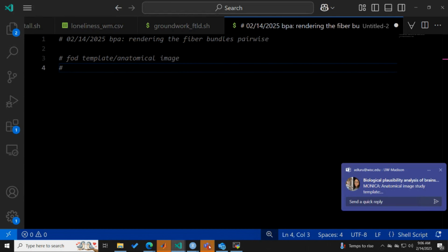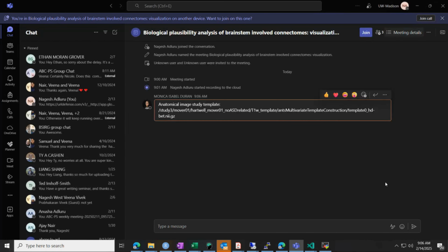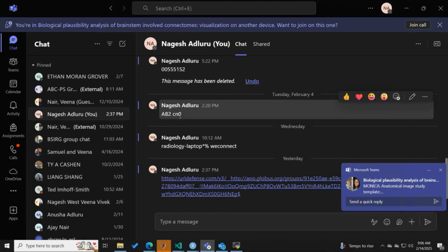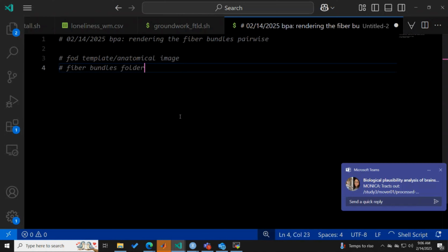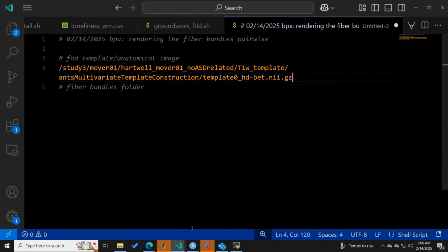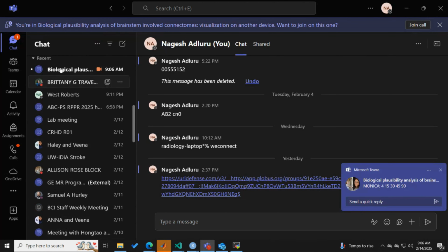And then the folder where the tracks are. I'm putting it in the chat too. And then you'll see where I put the 2 pound signs that corresponds to each of the different angles: 4, 15, 30, 45, and 90.